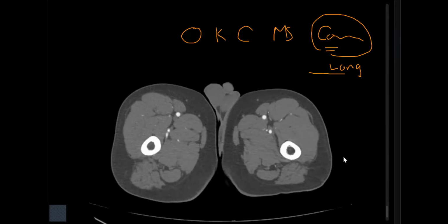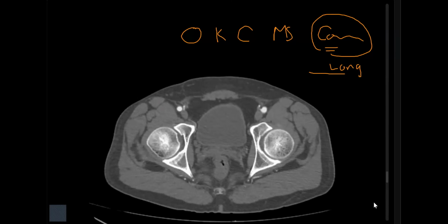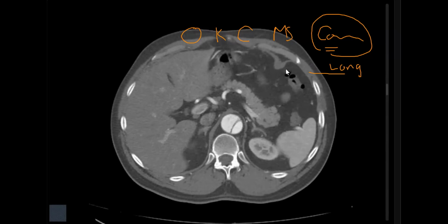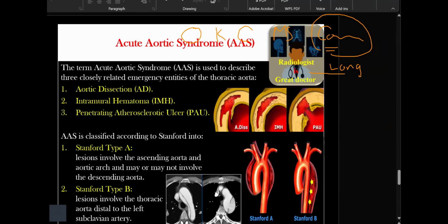In the exam, usually the cuts will be fewer than in Radiopaedia. Okay, it's very important. Regarding this case, it's a very common exam case. Today, this is the most common exam case, either in viva or long, or even short cases as a plain radiograph. How to proceed through this case? Now, let's revise.